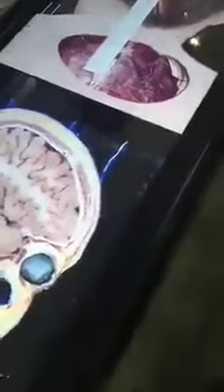So everything you see here is what we saw at 0.6 to 0.8 millimeter thickness. And so each time I turn around, slide through these sections, I can see where it lies. And you're not just limited to the head and neck, you also have areas like the brain, larger areas like the thorax and the abdomen, all the way down to the leg and foot.